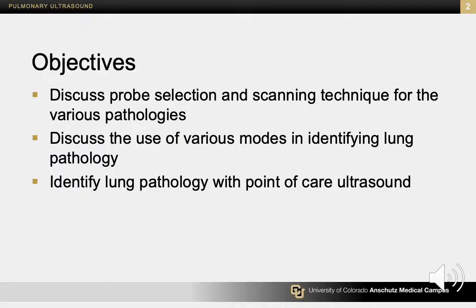So a couple of objectives. We're going to discuss some probe selection. We're going to discuss different scanning techniques for the various pathologies. We'll talk about patient positioning as well for different pathologies. Talk about some of the ultrasound modes that we can use for different lung etiologies, and then we'll discuss some of the etiologies more in depth.